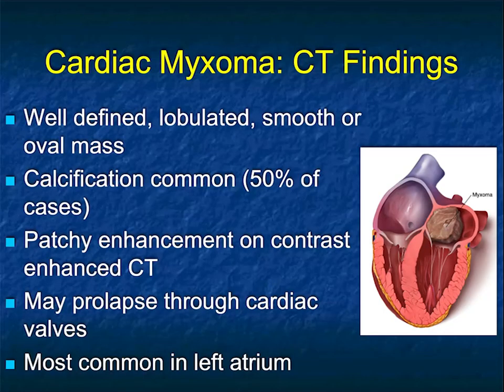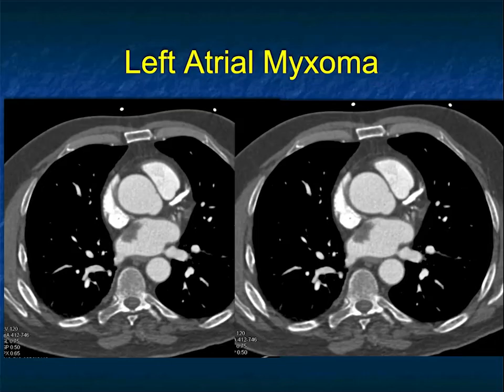And again, well-defined. Calcifications are, here I say 50%. It's more like 15%. Some articles have said 50, but those were older articles with smaller numbers of cases. The enhancement is minimal. Again, prolapse can occur, and it's left atrium.